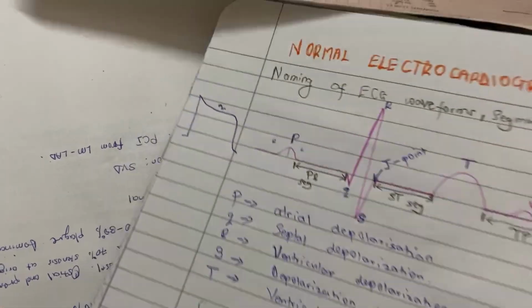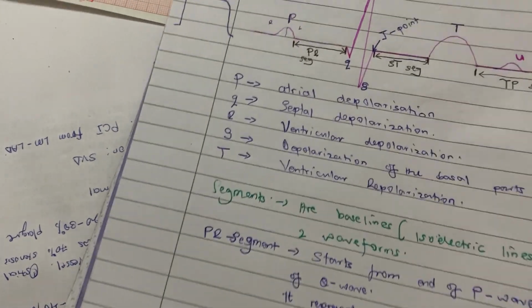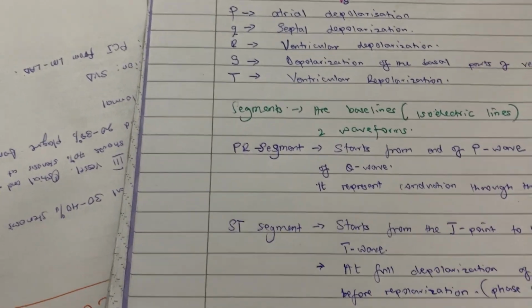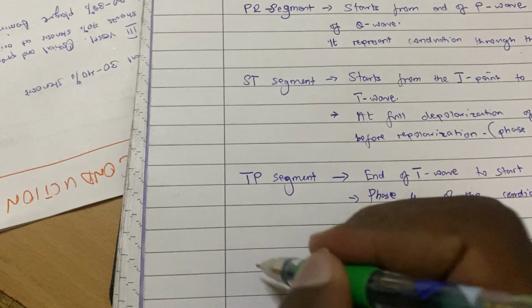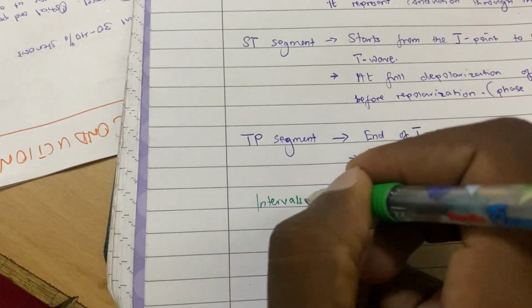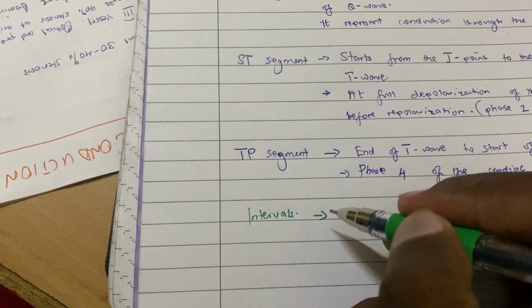Now the next one, they are intervals. What are intervals?